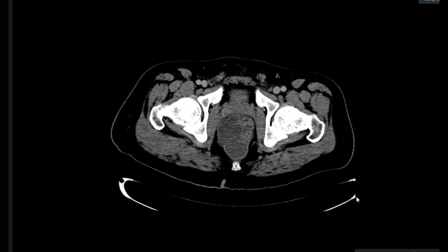You did a big mistake in the exam. You describe things and you jump immediately to looking for coronal and axial images, clinical scenario and other investigations, clinical history, before you summarize, before you put your differential diagnosis.